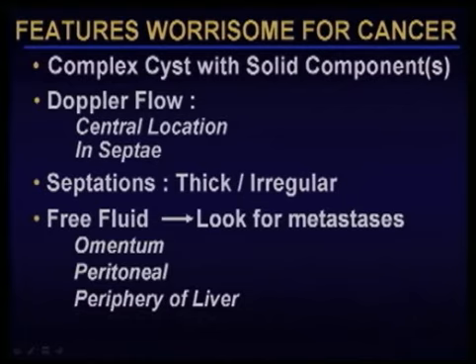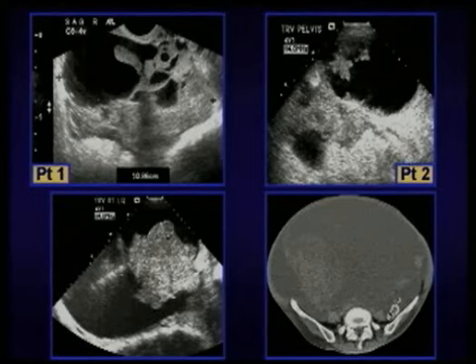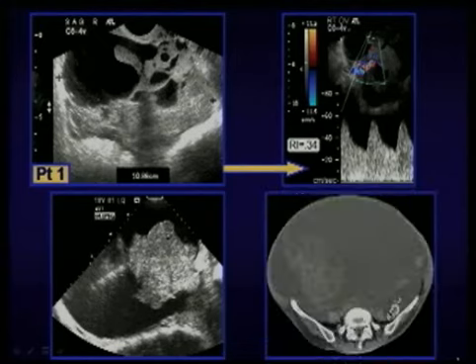And since it's in malignant ascites, it shouldn't surprise you that it often affects the edge of organs like the periphery of the liver. It can directly invade the peritoneum itself, and it can cause involvement of the omentum, which can cause thickening, and they tend to be large. So these masses look nothing like what I showed you before. All three of these people have ovarian cancer, and it's important to recognize that the appearance looks very ominous. So these should all come out.